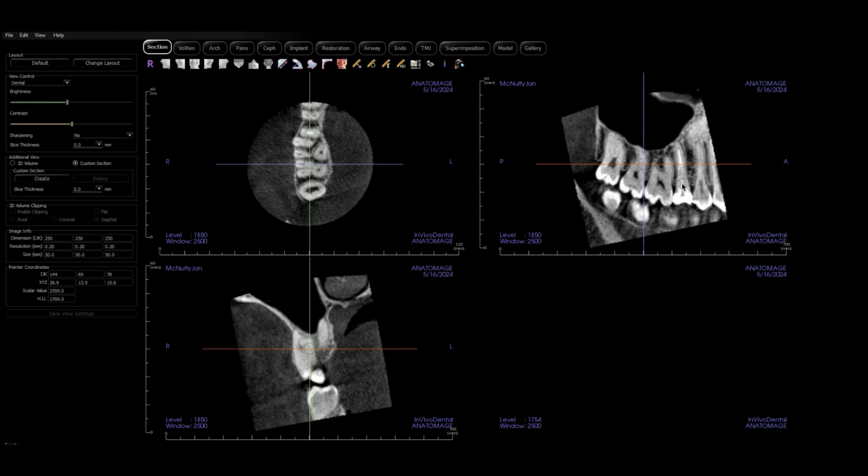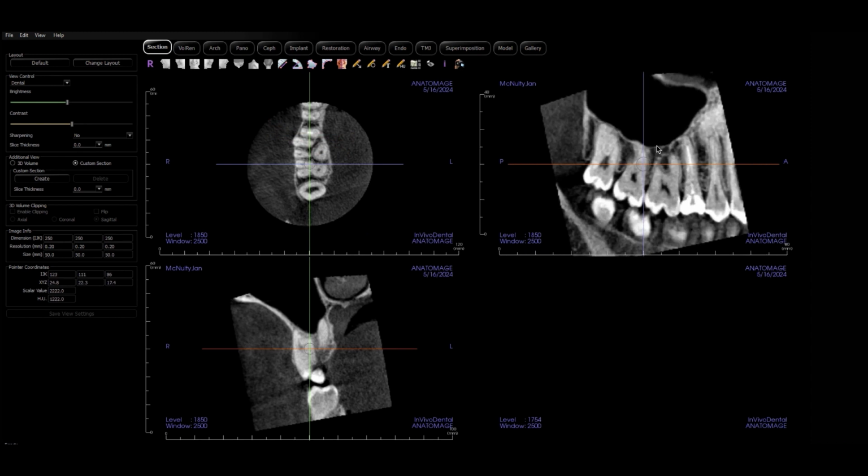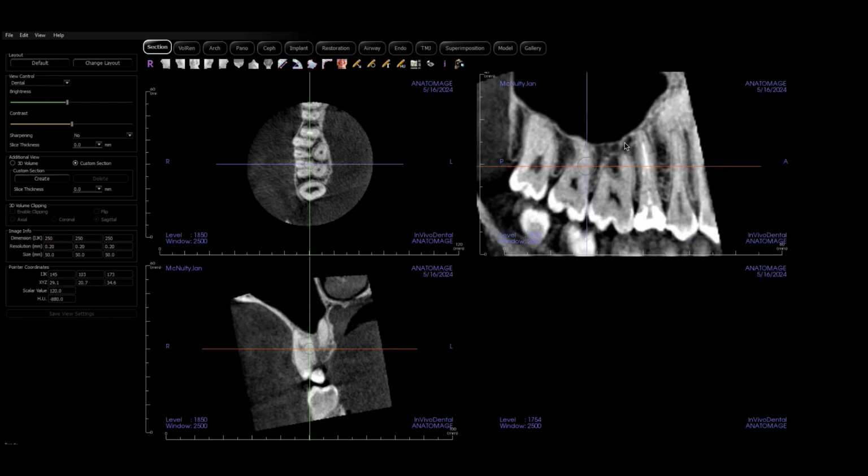As we know, especially upper premolars, they come in a variety of different iterations of canal sequencing. So in this case, from what it sounded like, it was one canal that split into 2. Obviously, one of the nice things about CAT scans is we can actually answer that question with a high degree of certainty so that we know exactly what we're dealing with.